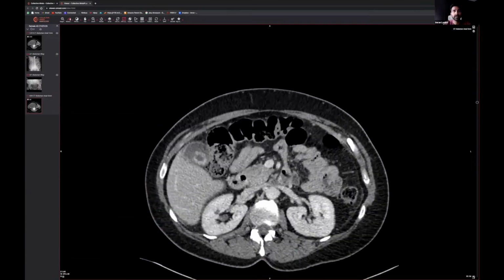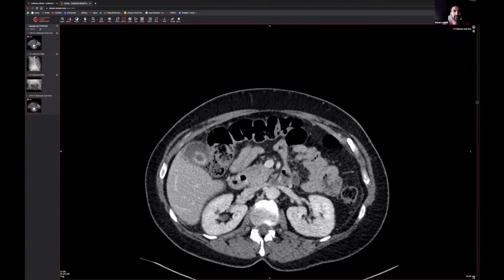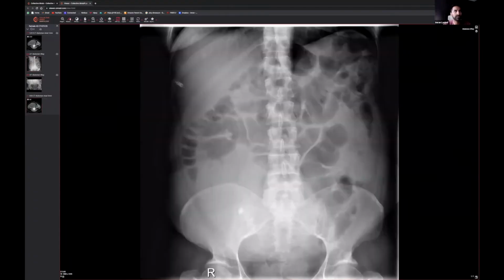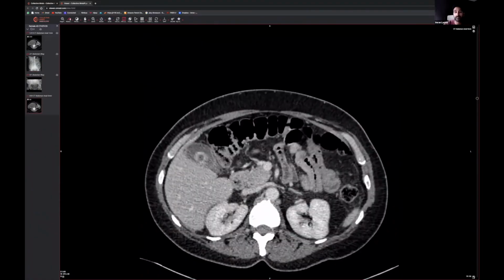And they're coming through. This one does have a few calculi. Can you see that? If we scroll through, you can see the circular density sitting over here. This is quite a good point. You can't see that calculus on the X-ray because it's not a calcified calculus, but on CT, you can see that calculus. But even on CT, sometimes you don't see that calculus because it's not actually that heavily calcified. Sometimes you get cholesterol calculi, which are not visible on CT and on X-ray.